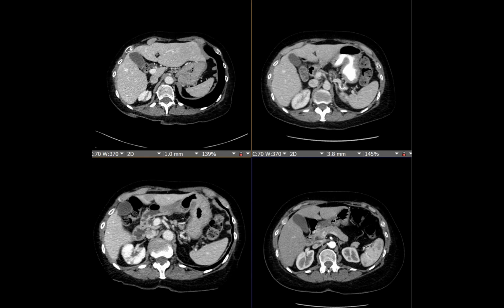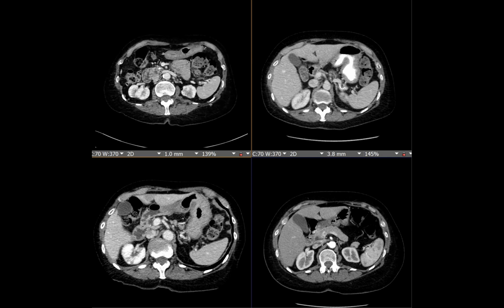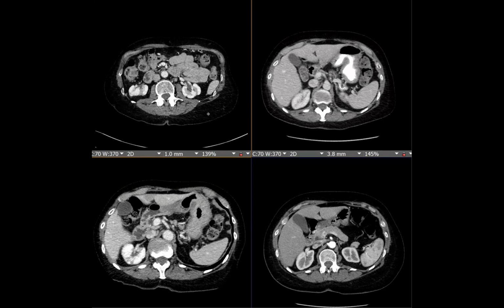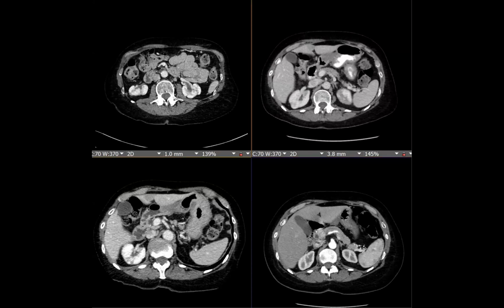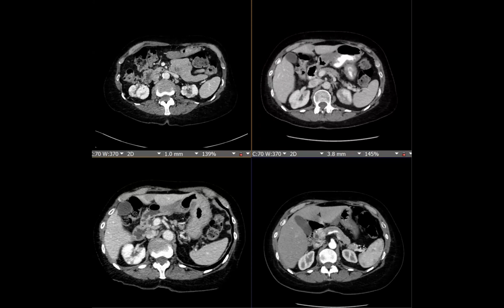So the renal hypointensities reminded me of IgG4. That's exactly it. Pancreas usually gets enlarged and sausagey, but it looks like it's withering away. And I don't know if they're on steroids or what. So this was exactly correct, and this was initially identified as a sausage-shaped pancreas. And if I can convince you, the lobulations are not really there, and it did over time wither away, and you can barely see it on the more recent exam.